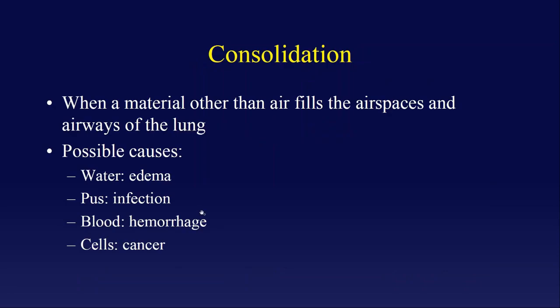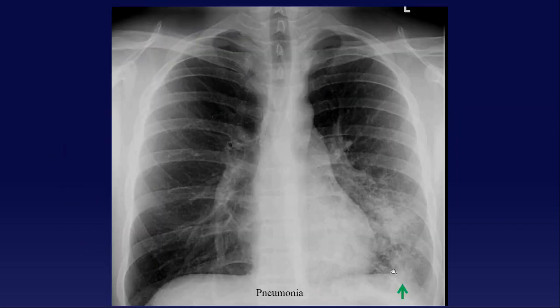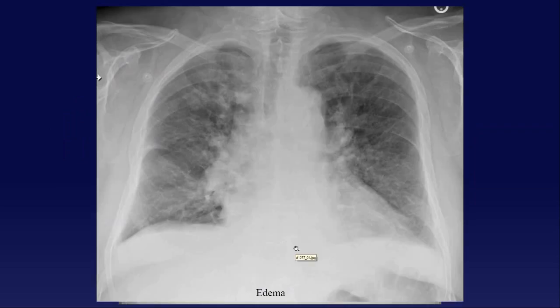Versus consolidation, which occurs when something other than air fills the air spaces, and this is blood, pus, water, cells, things that a lot of you have probably heard before. Pneumonia is very common, and may present with a silhouette sign as I showed before. Another example, well, this isn't a pneumonia, this is edema, but yeah, just something filling the airways.